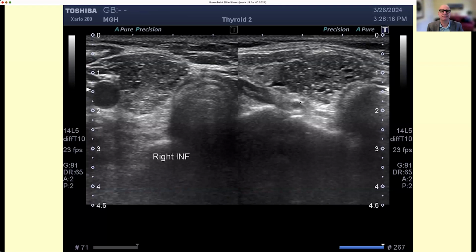Okay, any taker on this one? Let's be systematic and describe this nodule. And there's one thing I have to say: when you show images like this, you lose a lot. The ultrasound is really a live test that is based on a pattern generated in your brain by a large number of frames. When you take one still image, you lose a lot of that tremendous amount of information that you receive when you're looking at the ultrasound screen, constantly generating images. That's something you want to keep in mind all the time.